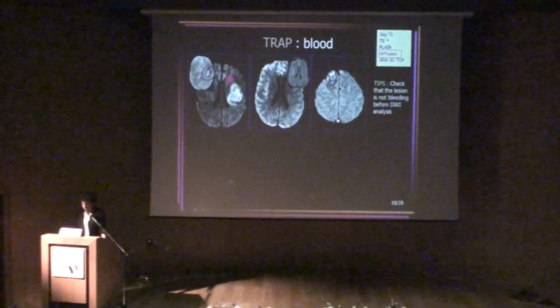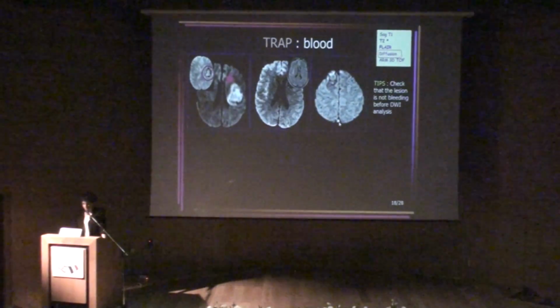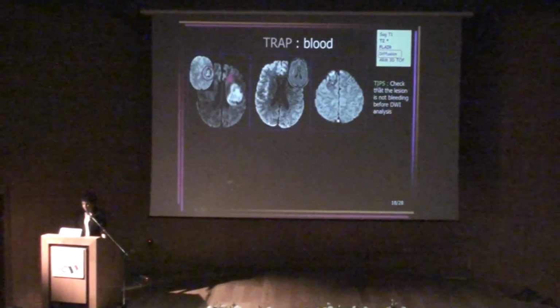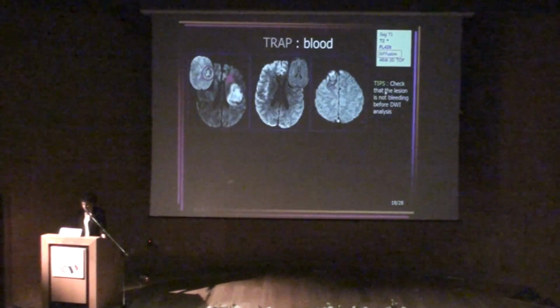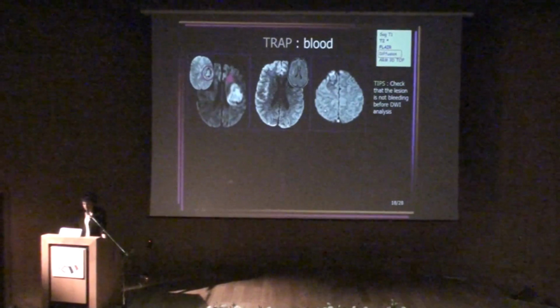And also the clot can be bright on diffusion. So the tip for the blood products is: check that the lesion is not bleeding before you analyze your diffusion images.